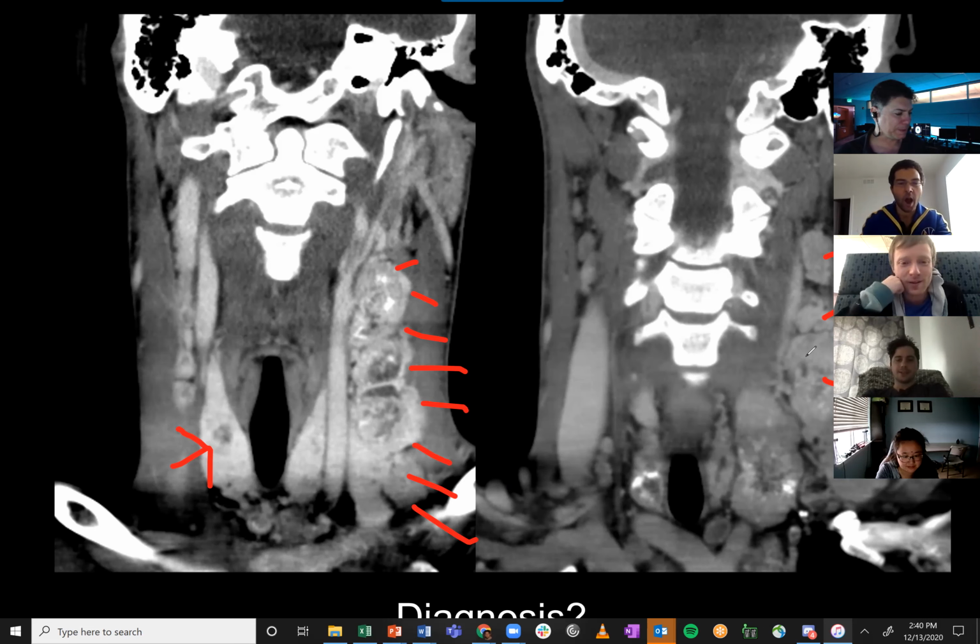What do you think about? I think it's metastatic thyroid cancer. And because of the calcifications, I think it's papillary. Well, papillary is more common. It's supposed to be 95% papillary and follicular. We group them both in a differentiated thyroid carcinoma, DTC. Often it's more mixed in our population. Everybody's patient population is sometimes different. But another thought is, do you know of any other thyroid cancer that may have weird stellate or snowflake calcifications within them? Medullary? Medullary, that's exactly right. This was actually a medullary. They're more likely to have these weird calcifications.